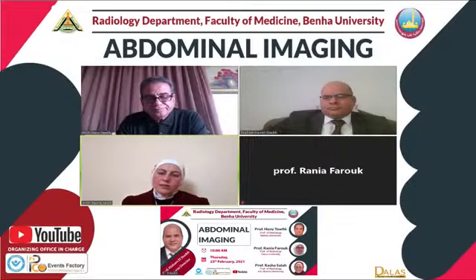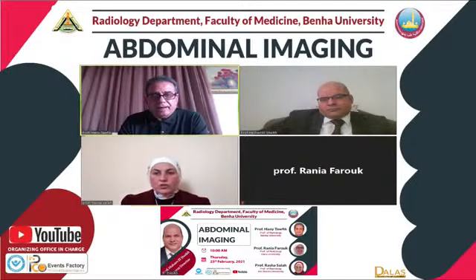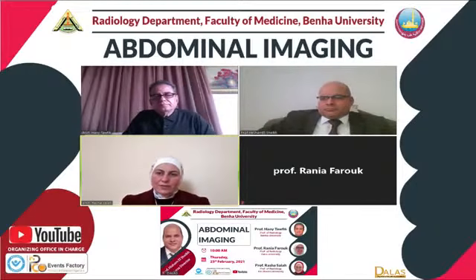هو ده يعني لو حضرتك بتعتمد على الـ exam اللي معمول، لو هو معمول على الـ rectum فقط فهو هيعمل just الجزء بتاع الـ pelvis. لو هو مطلوب abdomen وpelvis هيشوف الـ dissemination all over الـ peritoneum في الـ omentum والـ peritoneal gutters والكلام ده كله، ده هيبان لو معمول له كمان abdominal component. لكن at least من الـ pelvis ده هيبان بالـ MRI بس. ولا لازم PET MRI؟ لا، ده ممكن بالـ MRI لوحده يبان peritoneal carcinomatosis. الـ PET component في الحتة دي بيبقى weak. الـ MRI هو اللي هيبقى أعلى في الـ diagnosis. الـ weak point بتاعت الـ PET هي الـ peritoneal disease، لأن بيبقى الـ bowel جنبيها فيها uptake فبتبقى الدنيا ماسكة مع بعضها. لكن الـ MRI بنقدر نشوف الـ peritoneal disease very easy، بيبقى بالـ diffusion بنشوف.